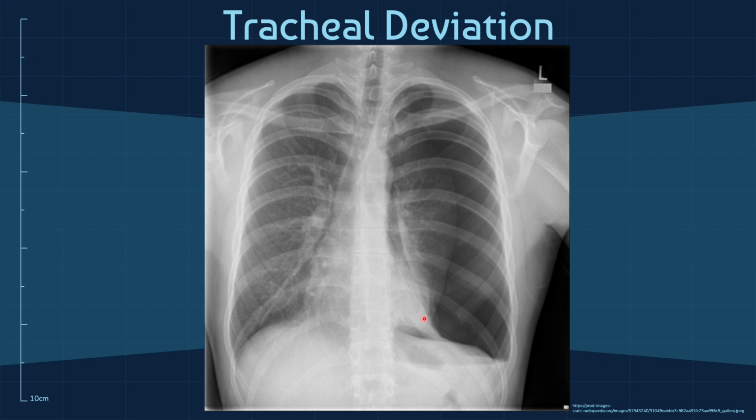And obviously we see that this lung isn't fully collapsed but is being pressured and flattened to one side, and this massive air over here causes the pressure to push everything towards the right. So we can see that there's mediastinal shift and tracheal deviation to the right. Thus we have a left-sided tension pneumothorax, which is an emergency. So if you're the radiologist or the doctor in the emergency department that sees this, then you should act quickly.